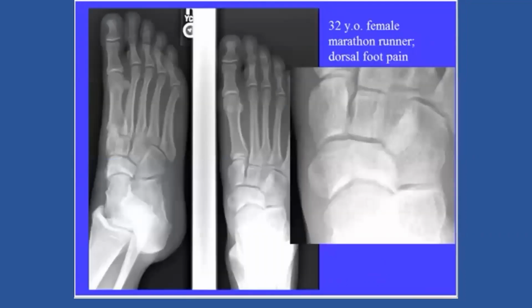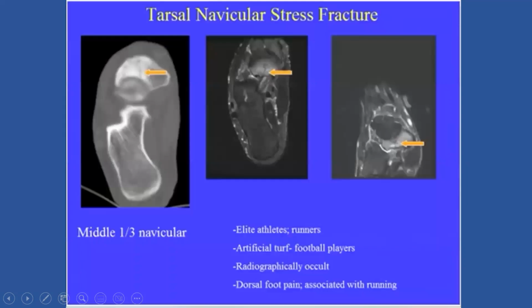Don't forget these findings. There is another sports injury secondary to overdoing, where you get a longitudinal fracture of the navicular bone. You can see it over here. I'm going to show it to you with the pointer. Here. We're seeing this quite often with the increase of sports. This shows it further.